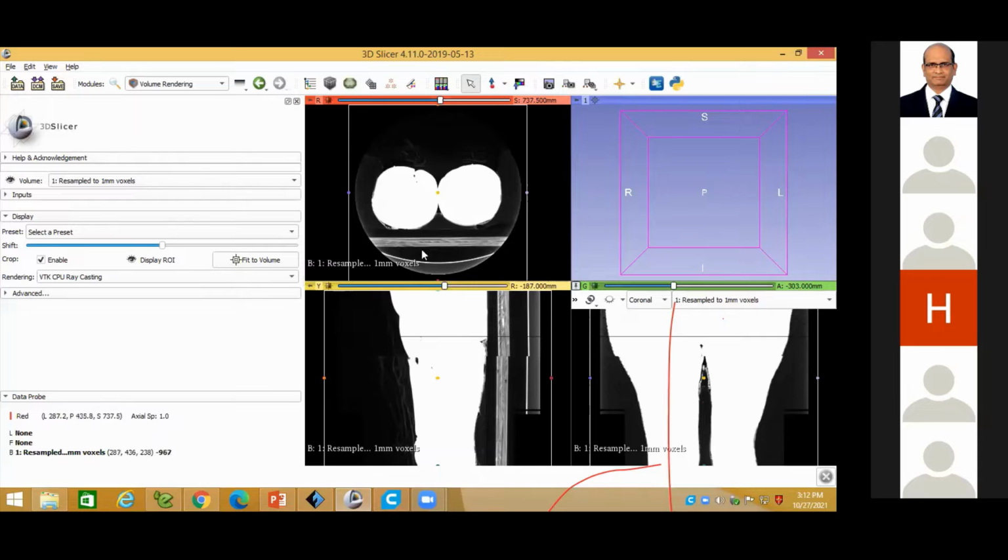Here in this box, whatever the region is there, whatever the tissue is there, that you can see and extract. That's why we are taking the ROI here. Then in the different 2D views you are going to extract, I want to see the 3D view. Just click here, center the 3D view on the same.